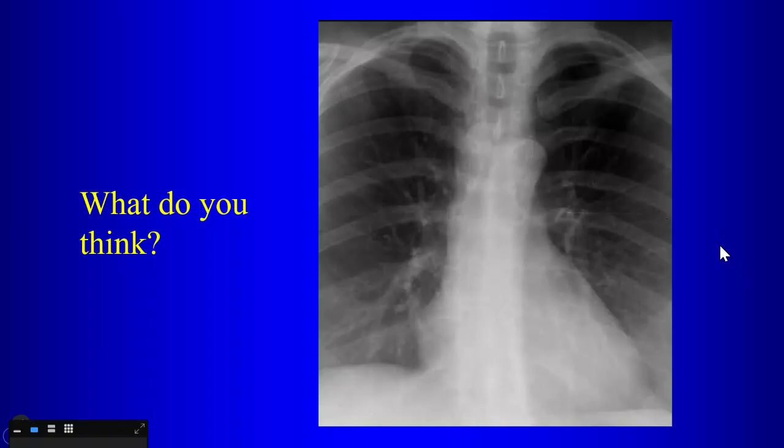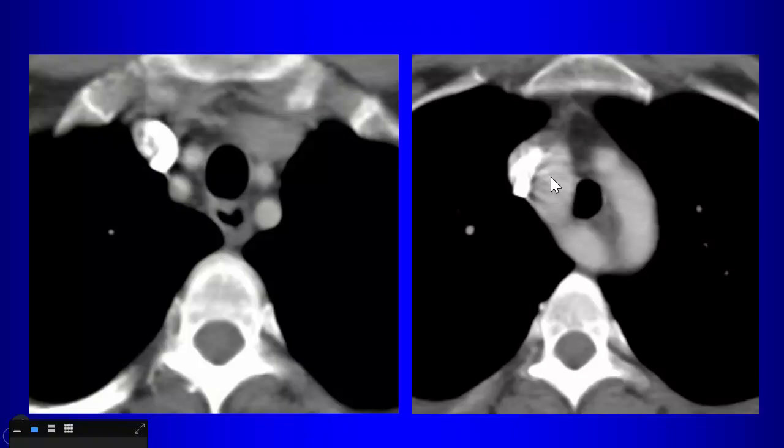So this is the most common symptomatic vascular ring. Persistence of the double arch is the most common symptomatic vascular ring. Easy diagnosis, you'll see two arches. The ascending aorta splits into two arches. They then combine into the descending aorta posteriorly. There's a symmetric takeoff of the carotid and the subclavian from each arch, just above this level, right?